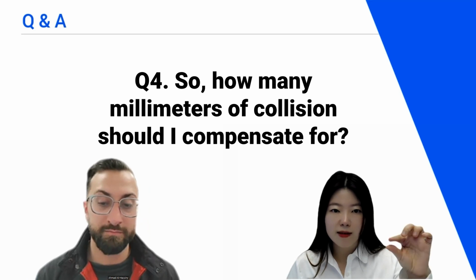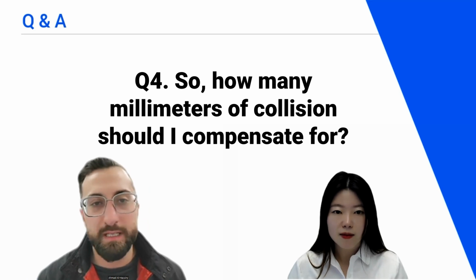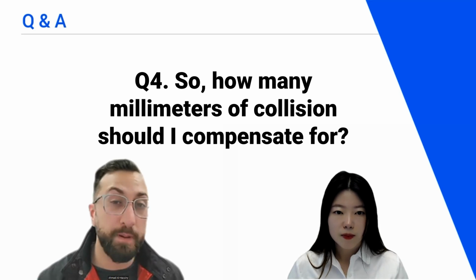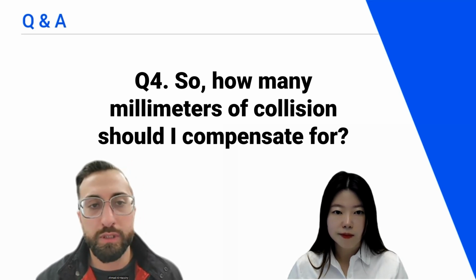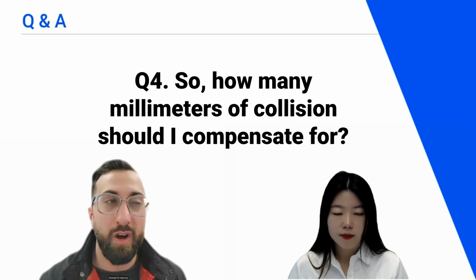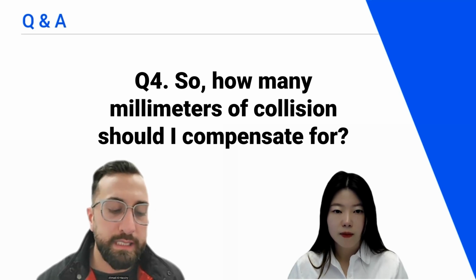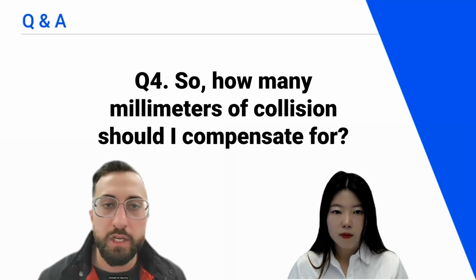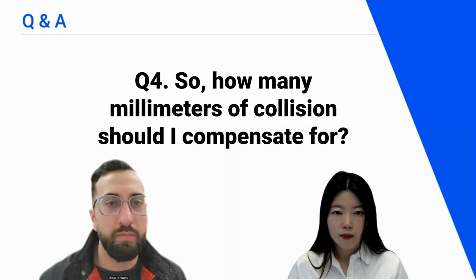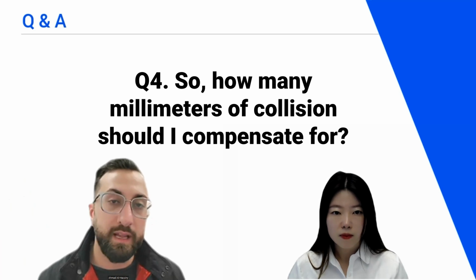So you think that less intersection is quite okay? Yeah, a little bit. If it's a little bit of spots here and there, I really don't find this to be super significant clinically. Of course, it's going to depend case by case, and honestly, have that discussion with your lab about what they're comfortable with. But I don't really see these little tiny spots of intersection being an issue. I accept those. It's more so where it's like 2 millimeters, 3 millimeters, in an entire quadrant. That's when I see an issue.